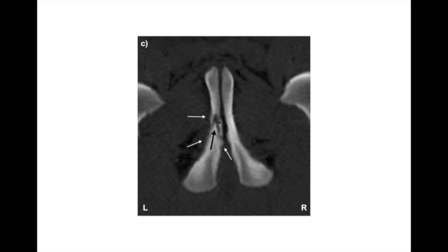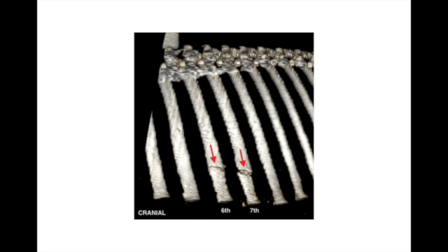The thoracic scans demonstrated the presence of closed, transverse, mildly displaced fractures with bone callus formation at the level of the distal aspect of the 6th and 7th right ribs, most likely related to birth trauma. Anti-inflammatory and antibiotic therapies were administered during the hospitalization.